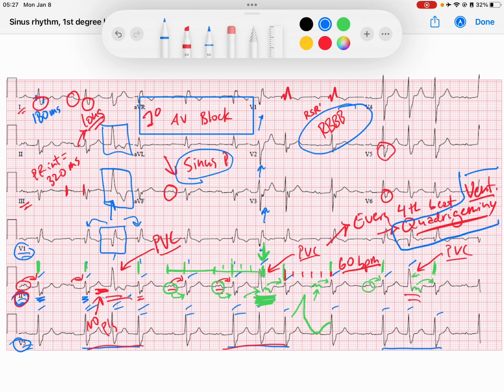It's really difficult when you have atrial activity buried in ventricular activity, but I urge you to continue to scan through all the leads. One QRS complex in one lead isn't enough. You need to get the full picture, and scanning vertically can really help in these scenarios.